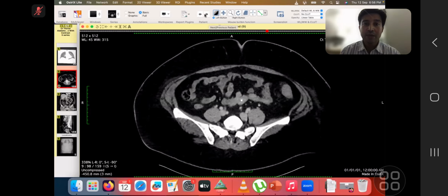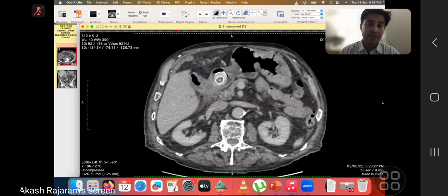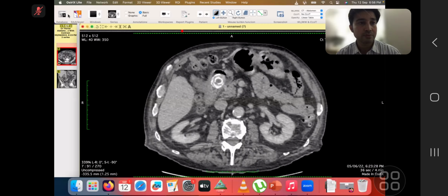Okay. We'll go to the next case. The next case also you did really well. The patient had a prior ultrasound. Let me see if I can show you the ultrasound.